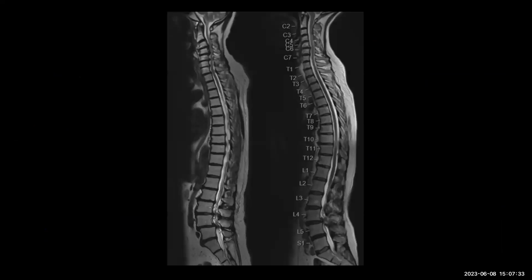Okay, great. So we're talking about determining the level so that the treatment can be guided to exactly where the patient needs treatment from. And this is where we started from: in an ideal world, you might have the whole spinal MR, and there are certain MRs, particularly the new ones, which can do this for you. So this is the most certain way of counting the number of vertebral bodies.